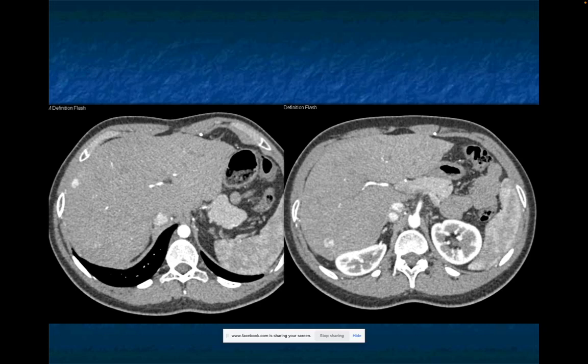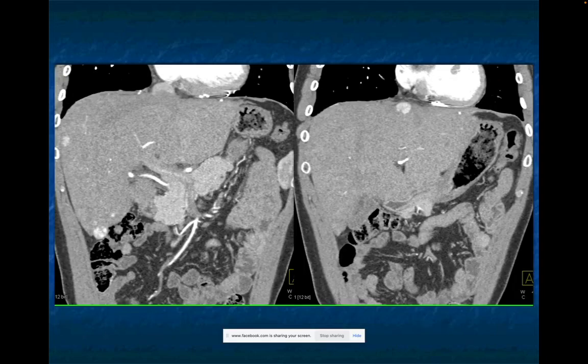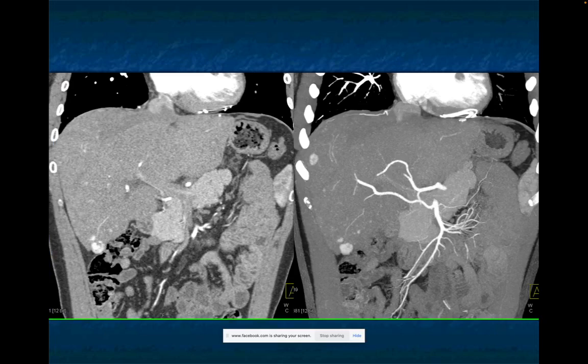Now you could say multiple metastasis, metastatic renal, but the kidneys look good, but other mets, thyroid. Hepatoma, multifocal hepatoma, small lesions, I don't typically like that. Cholangiocarcinomas can be multiple, but then they're typically hypovascular. Metastasis is really good, thyroid, lung, renal, all those possibilities. But what else? Focal nodular hyperplasia, hepatic adenomas. These are all small, and the cirrhotic liver makes me worry.